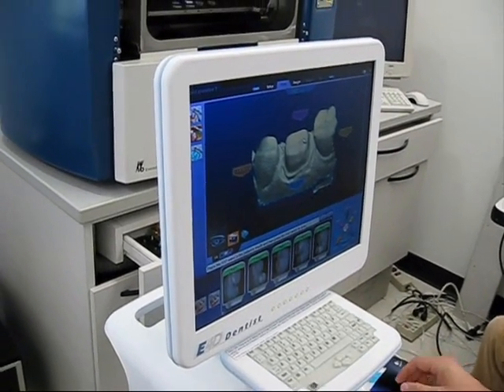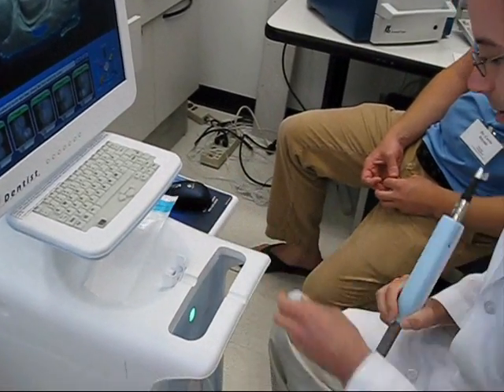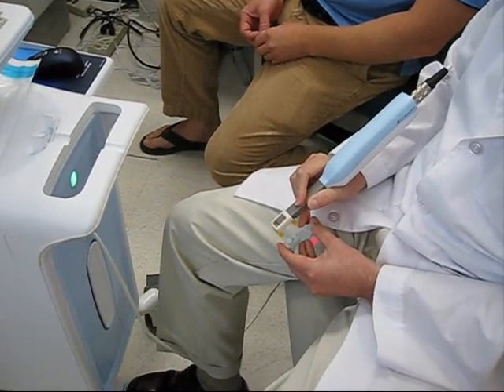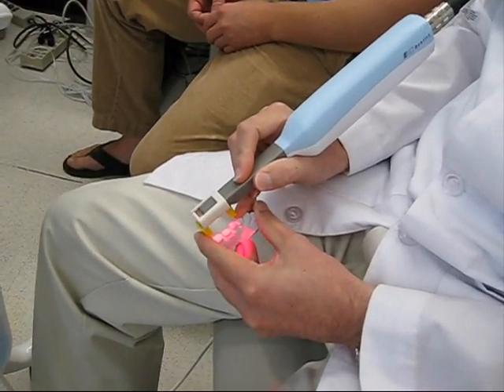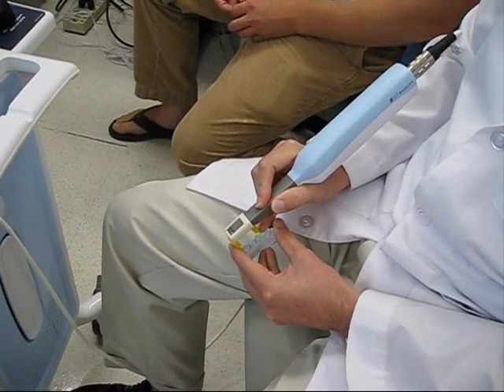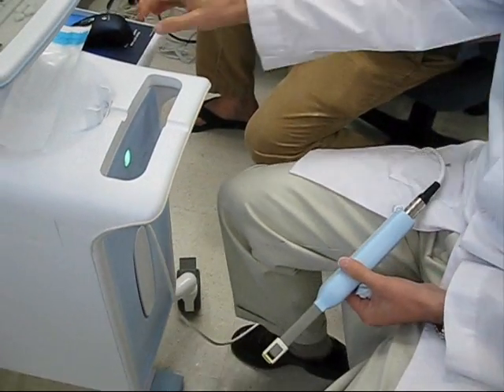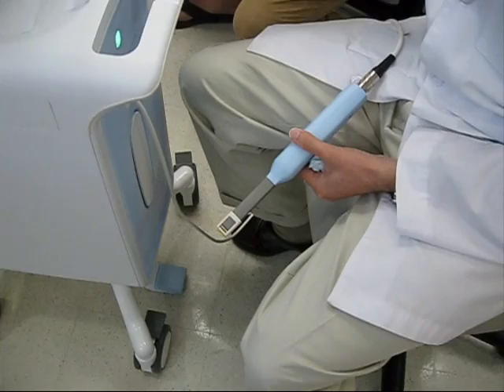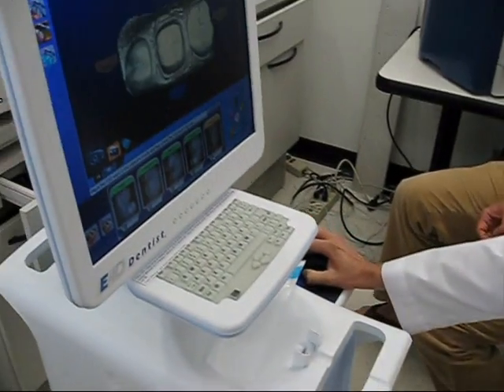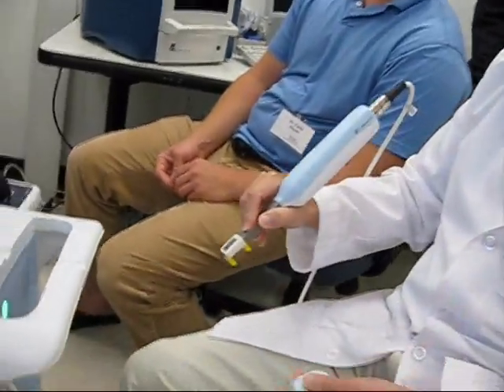Yeah. Why don't I just demonstrate? Let's say you were way off. Let me see if I can get a red scan in here. So what I'm going to do is just lift this up off the model, and it'll probably be a red scan. Oh, it's yellow. Yellow indicating that, again, it didn't really capture all the data that it needs. If I want to toss this, I just click on this symbol here. It'll throw out that information. So you don't have to restart anything.